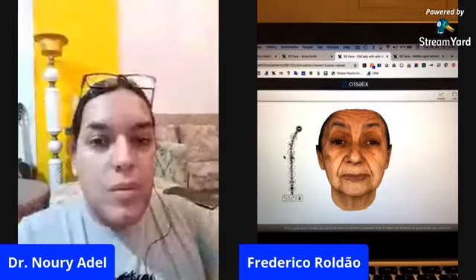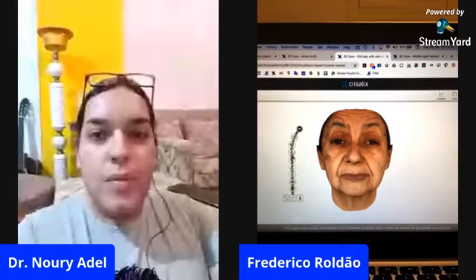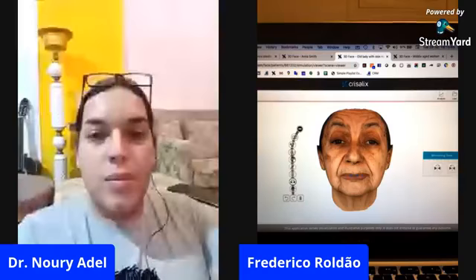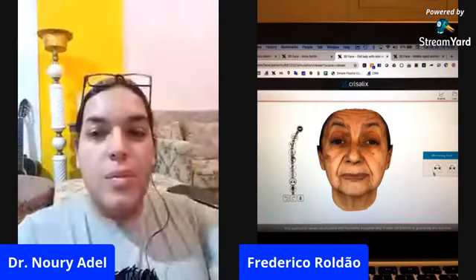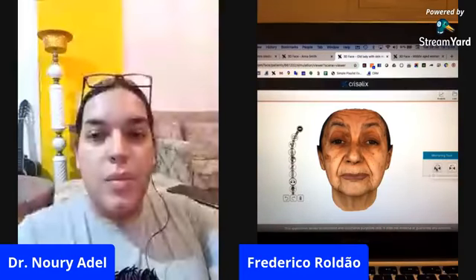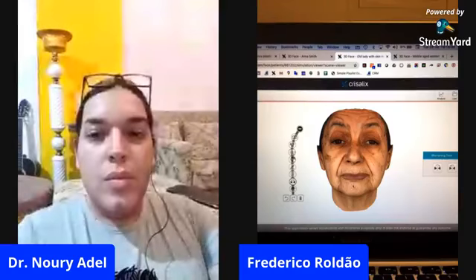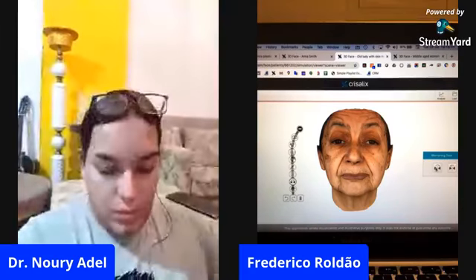But what if we want to see visually how asymmetric or symmetric this patient is? So we can just use this amazing tool. If I go on this button here, I will flip the right side of the face onto the left side. So we will see the patient mirrored as if she was totally symmetric.